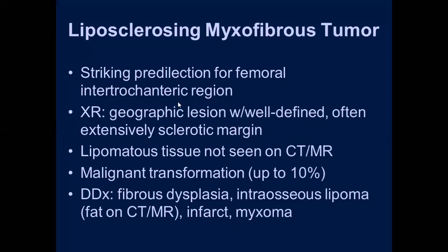Yes. So it is a bony lesion with well-defined sclerotic margin. Yeah. So this is what is called liposclerosing. Sure, the most important is to mention the differential diagnosis. He mentioned, sorry, the differential diagnosis. It will go with infarction, yes.